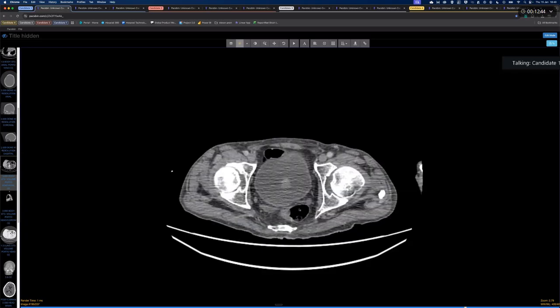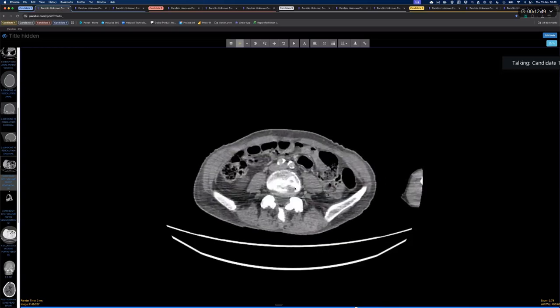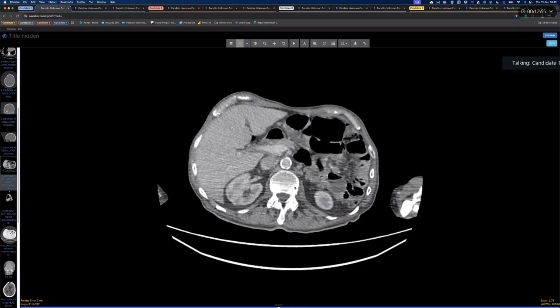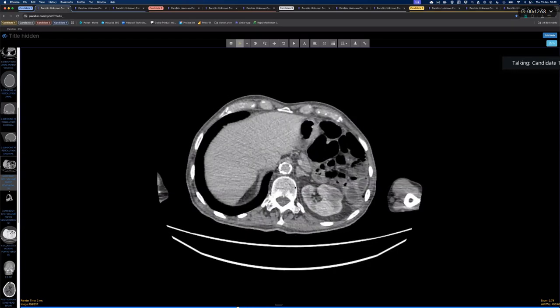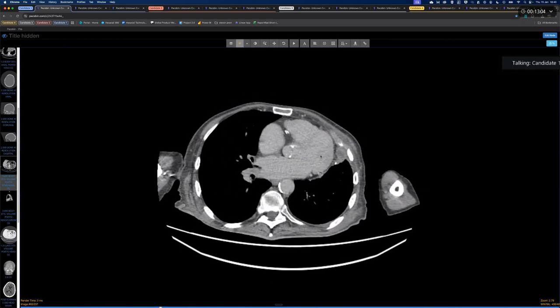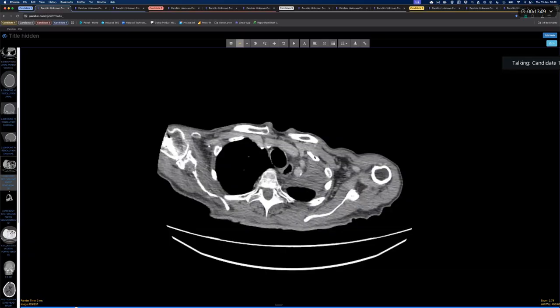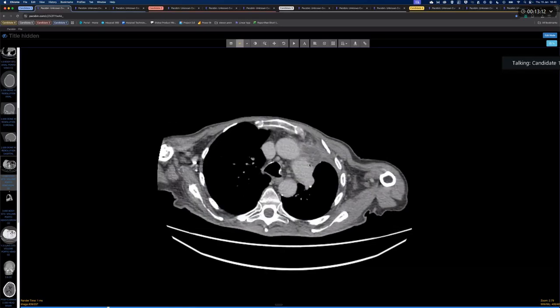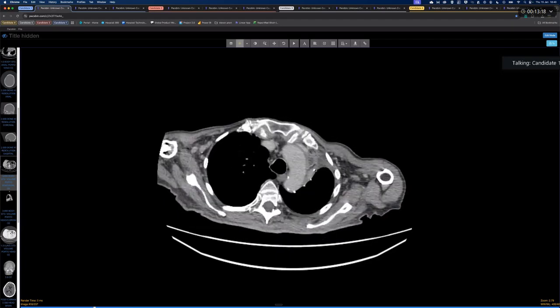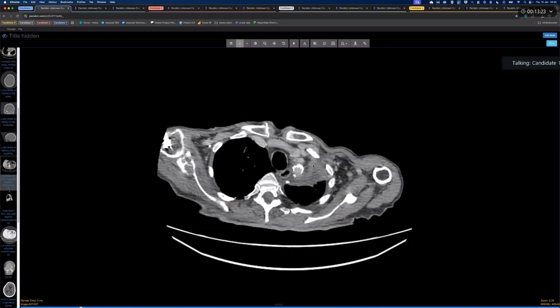Going through the abdomen, there is no ascites, there is no peritoneal thickening, no caking. I couldn't appreciate retroperitoneal lymphadenopathy. The liver is non-cirrhotic with no focal lesion, and the adrenals are unremarkable. The spleen is also unremarkable. There is an abnormal soft tissue lesion with a central cystic component representing necrosis with peripheral enhancement seen in the left upper lobe, abutting the mediastinum and the aorta.